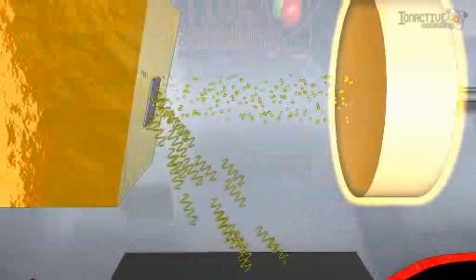The target is typically a piece of tungsten or molybdenum, which may be embedded in a stationary water or oil-cooled rod, or on a rotating disc. The high-speed electrons collide with the target and rapidly lose energy. There are two X-ray producing interactions between the incident electrons and the atoms in the target.